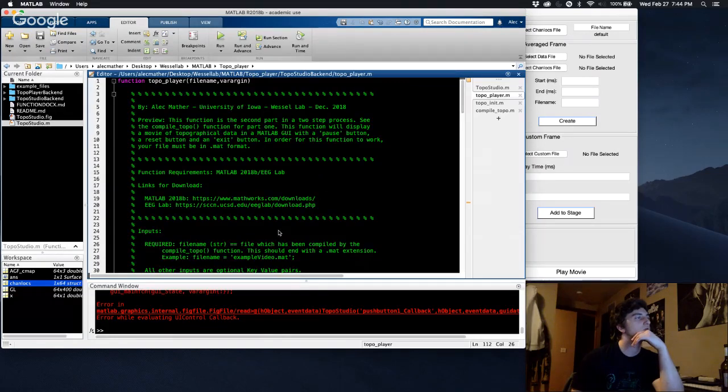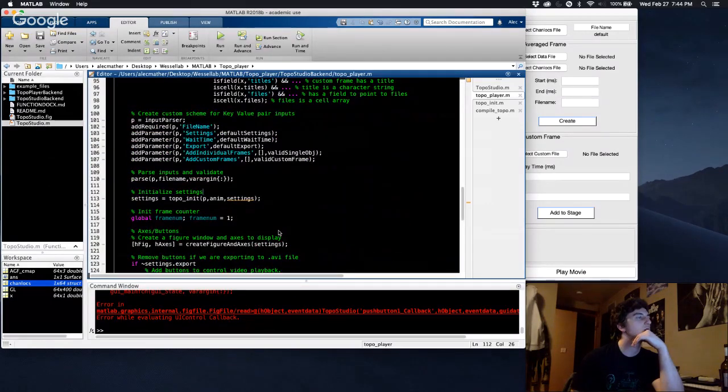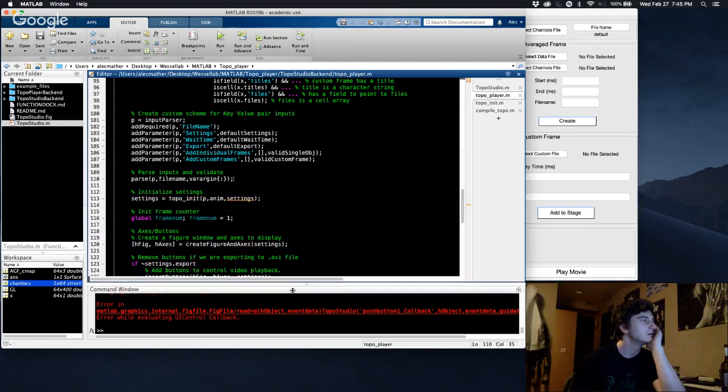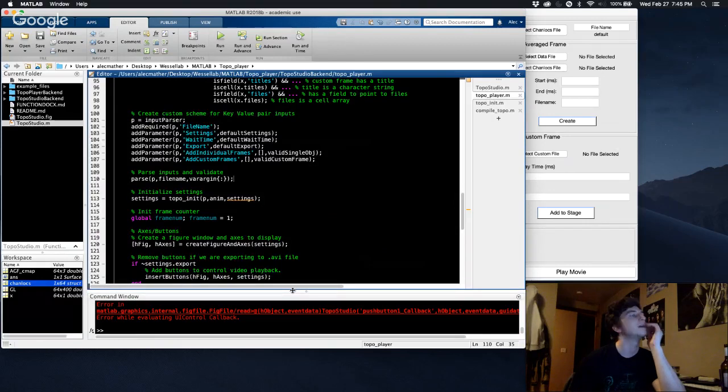So we aren't, I see what's happening. We're not passing the settings in, but we are, but we're not. Like, we're only doing it if we pass it in via an argument. So what we have to do actually, 113, oh, I see what's happening.